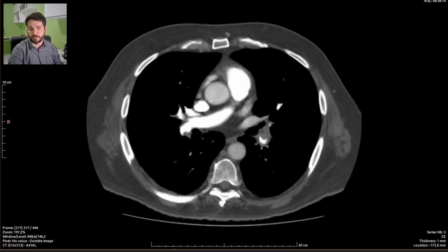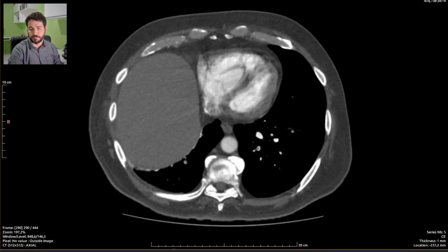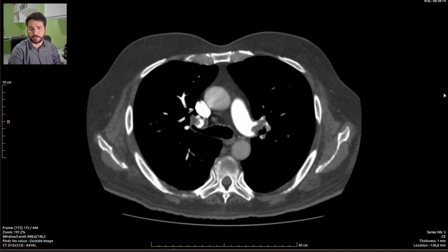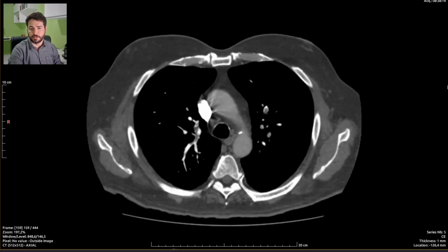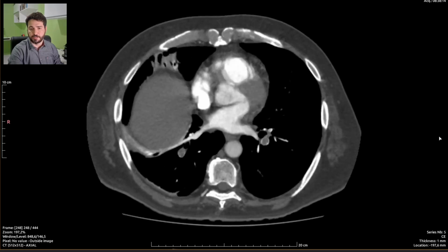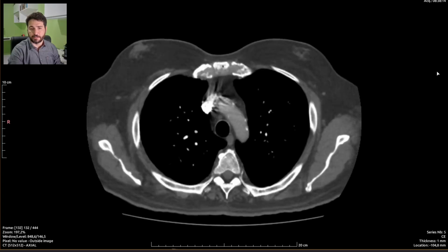Right here, as you guys can notice, the vessels are enlarged and filled up or partially filled up with contrast, and wherever isn't filled, it's actually black or dark, irregular, with acute angles towards the borders, the inside borders of the vessels, which tell us this is real acute pulmonary thrombosis. So this is a massive, extremely dangerous and life-threatening disease.